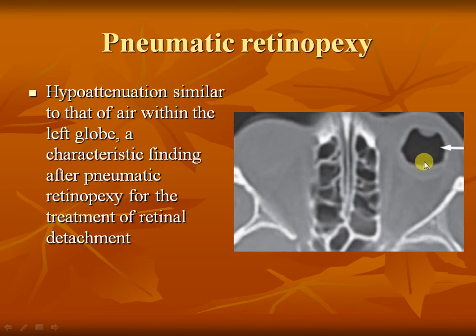Here is what we call pneumatic retinopexy. They inject air in the eye globe. You can see it's radiolucent air density within the eye globe.